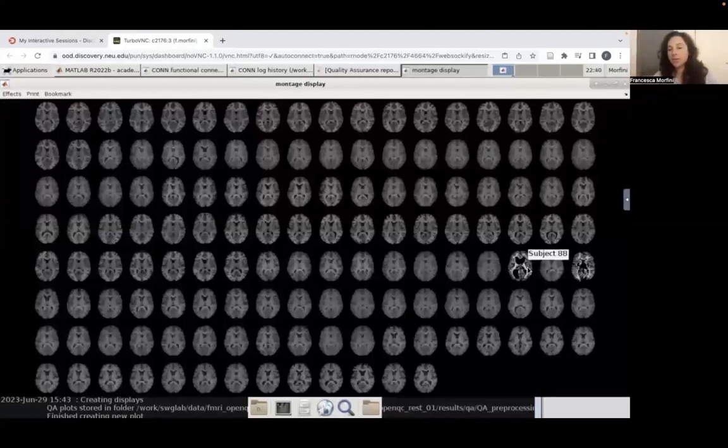And again, these two stand out for a number of reasons. At the same time, maybe this way of looking at the data is not fully representative of other potential issues, and quality control metrics such as QA norm or any other automatic quantitative QC metrics may be more sensitive to them. So it's really an interplay that is so effective in this case.